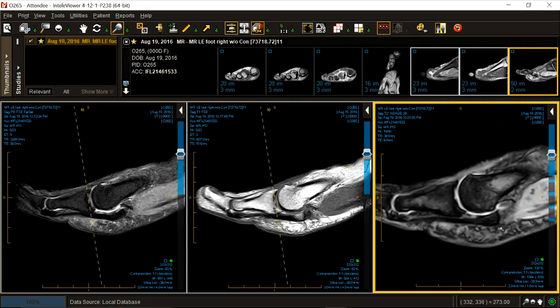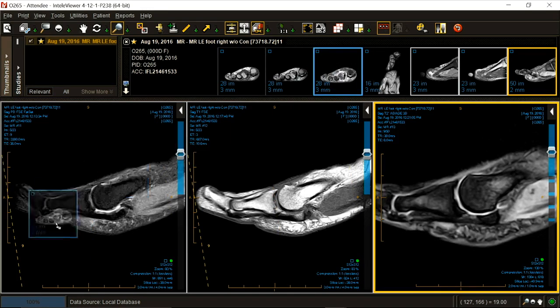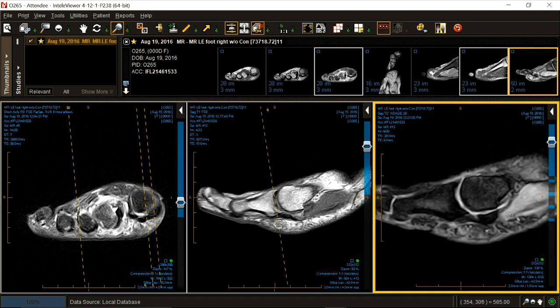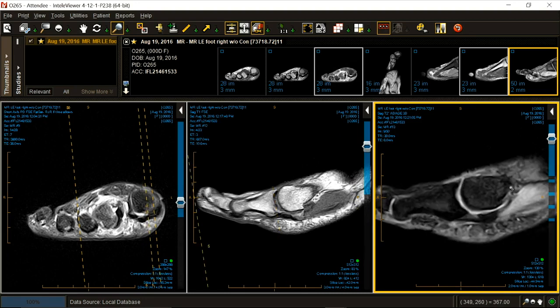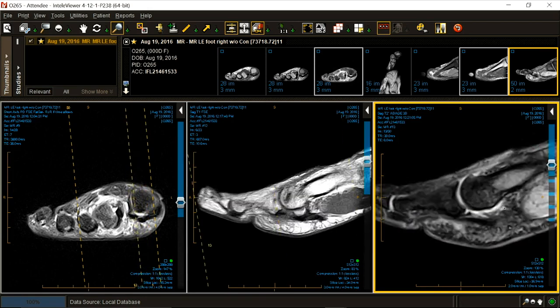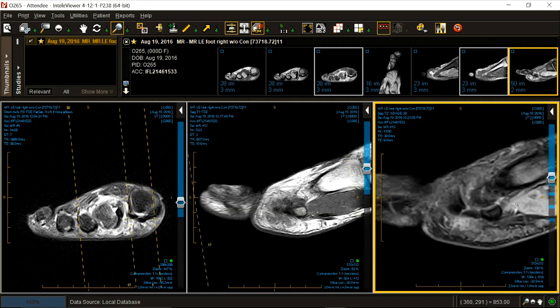Here's our sesamoid. Which sesamoid is it? We'll cross-reference. It is the tibial sesamoid. What inserts on it? The flexor hallucis brevis. And you're seeing one of the suspensory ligaments, the metatarsal sesamoid suspensory ligament. It's the other sesamoid. There's the other FH brevis, the lateral one.